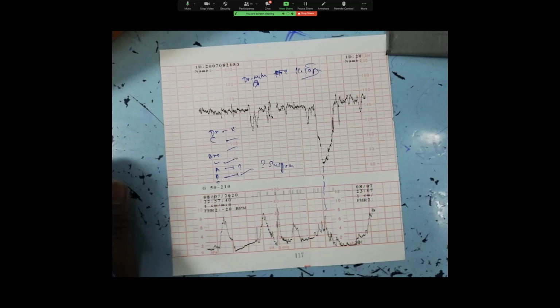But here we have to continue this CTG for 30 minutes or so, and still, if the late deceleration starts occurring in at least half of the contractions or more than half, then we are worried. Then it becomes an abnormal feature, and therefore one abnormal feature would mean that it is a pathological CTG. So it is not enough for us to judge whether it is pathological at this moment. Okay, got it?